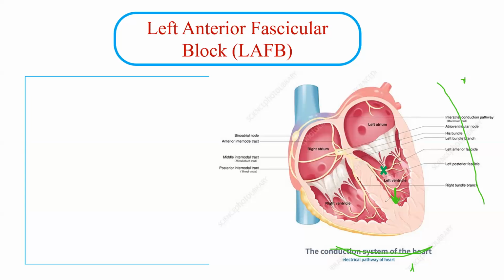Okay, after that, the electricity now will disseminate everywhere and will go to the whole part of the muscle. So the axis will go to the other side. So after that, if we look here, the electricity is going toward the lateral leads, so we will have an R wave, and the same electricity is going away from the inferior leads, and this will give us an S wave. And these are the criteria, that's it.